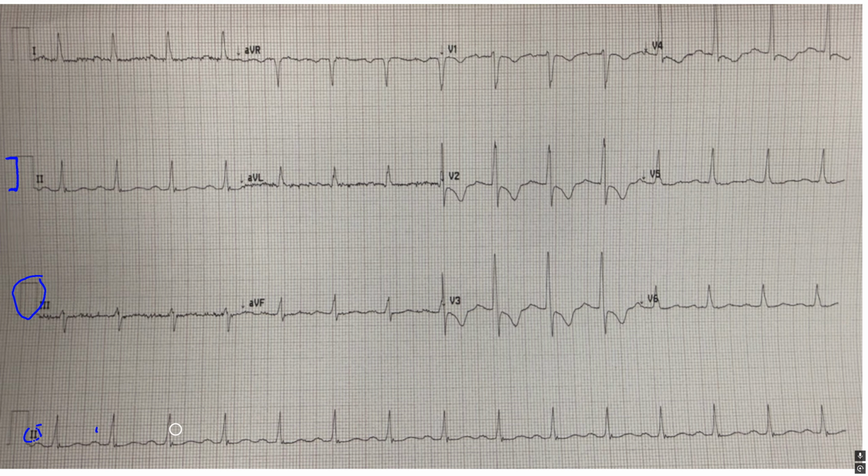But anyway, I see 1 P for every QRS. Okay, so sinus. Rate looks maybe fast-ish. These P waves are looking a little bit enlarged to me, and they're biphasic in V1 and V2, which can be a sign of atrial enlargement. For the axis, we're up in 1 and up in AVF, so normal axis. Okay, so for the intervals, the QRS, let's see, we got 1, 2, 3. Okay, all right, we're getting there.